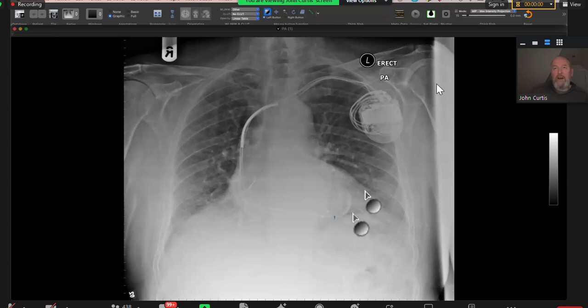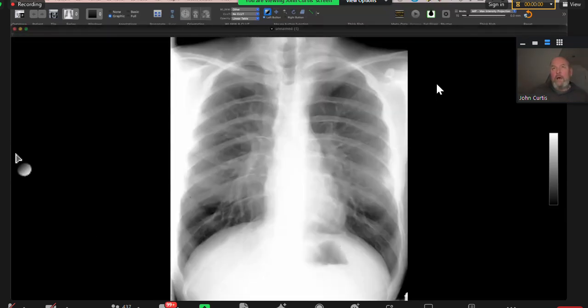That's a pericardial fat pad. Left ventricular aneurysm. Rib notching, but if you look on the side of the film, you can see extrapleural lesions, and this is neurofibromas.